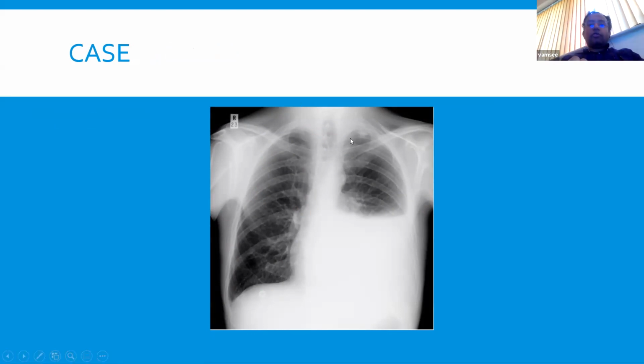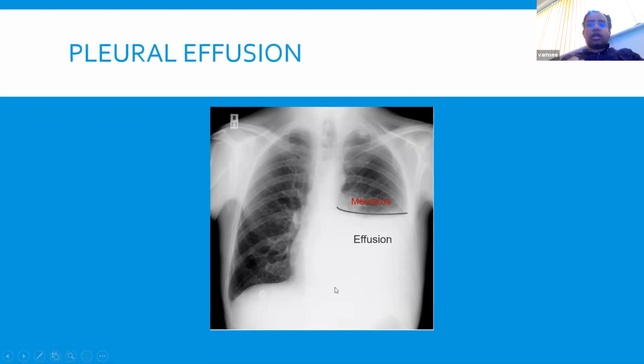So here you've got a very clear abnormality, which is your classical effusion. The giveaway sign here is that you've got a meniscus with an effusion. This is sort of a whiteout of the area underneath here. And you've got relatively normal lung superior to that. Usually with pleural effusions, you can also have a bit of mediastinal shift, but it's so hard to see here because everything is whiter on this side and this side. There might be a bit of shift there, but it's not that prominent.